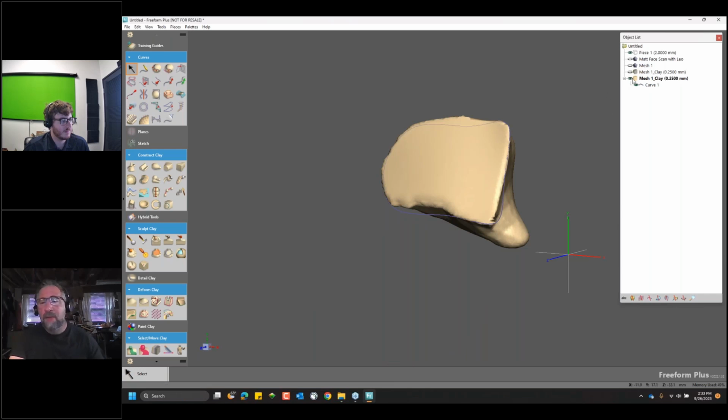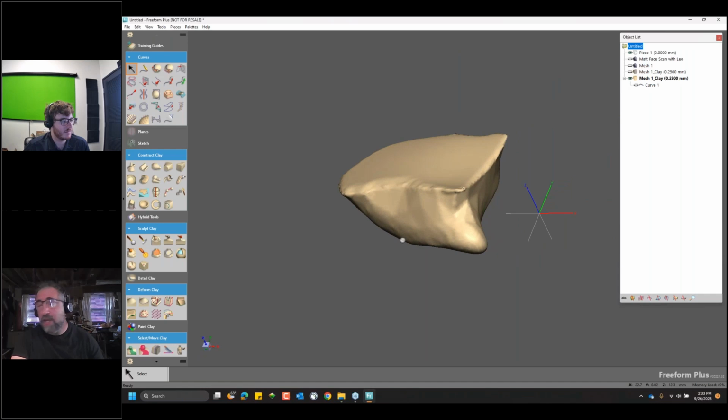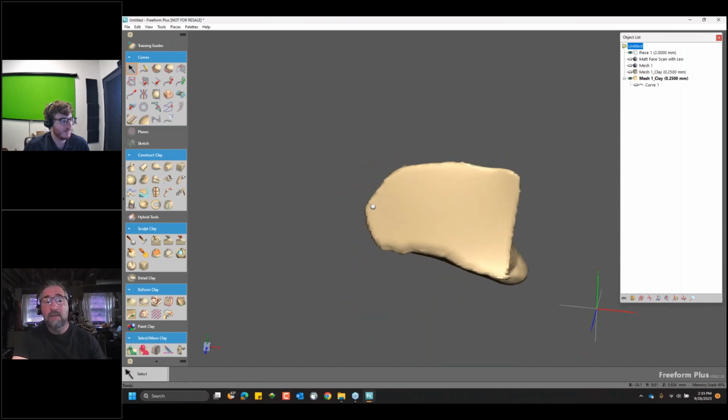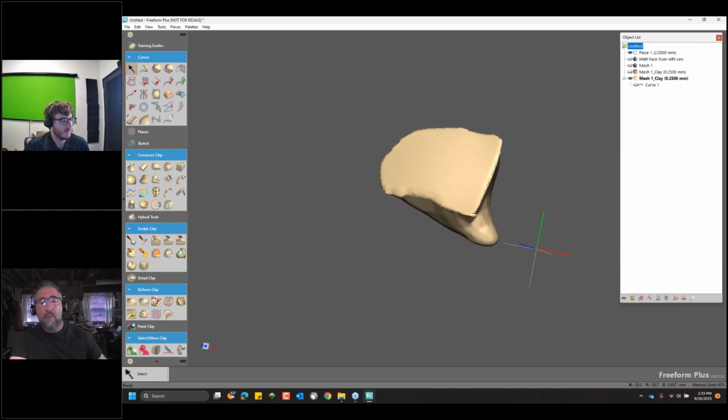There's a lot of cleanup work, there's a lot of additional work, and of course, in order to manufacture this, there's a lot of other things to consider. This is where automation is going to be your best friend. You spend some time after you get your scan data, and you build up a workflow that works for you, and you can create automated tasks that will take care of the individual pieces of a workflow or an entire workflow. That means you don't have to remember, you can follow along, you can let the computer do a lot of the work.